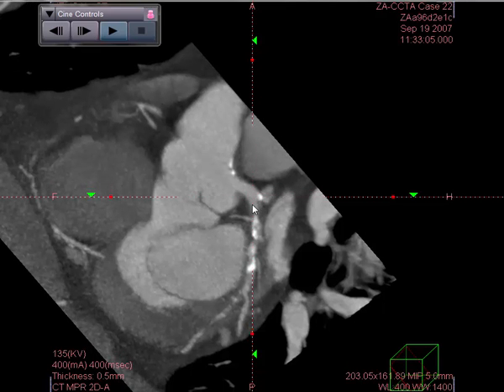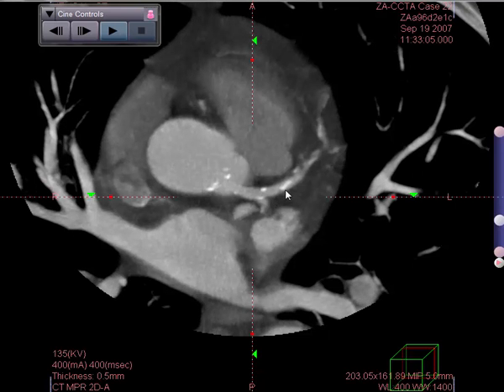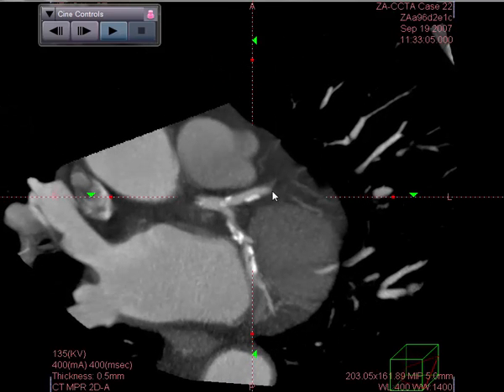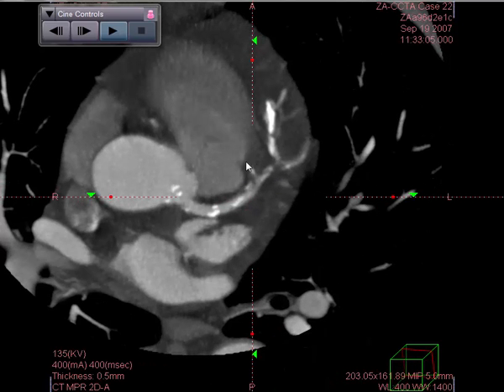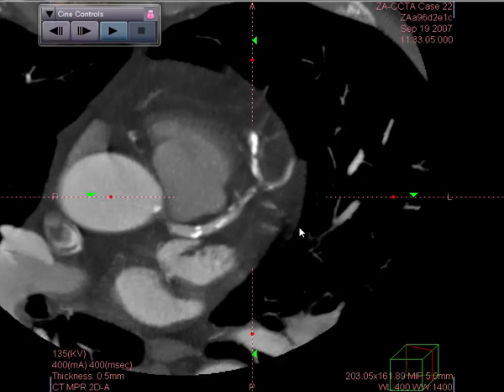Let's start looking now, going to the foot view. Let's start looking at the left anterior descending. There clearly again is some mixed plaque in this area. The very proximal portion is non-obstructive. Immediately beyond that, though, switching to the foot view, we can see that there is a focal area, what appears to be largely non-calcified plaque that appears to be obstructing, or it could even be subtotal.